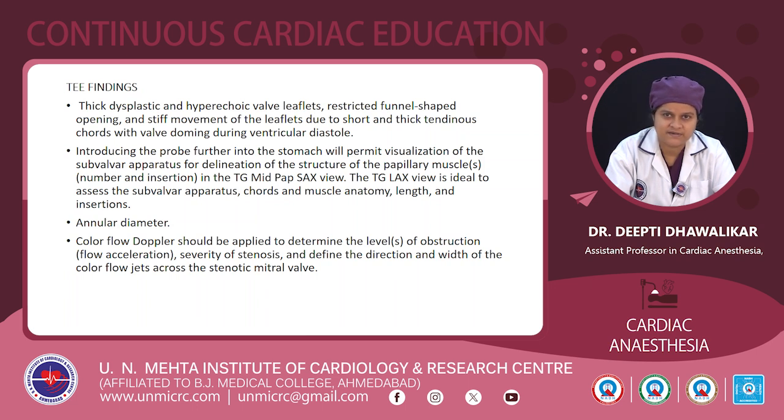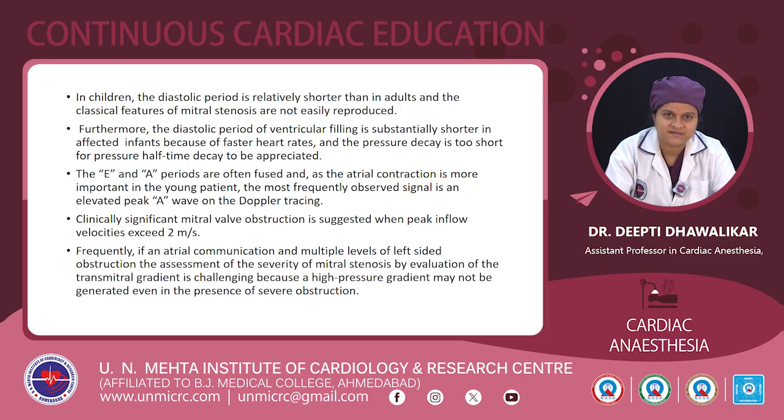The transgastric long axis view is ideal to assess the subvalvular apparatus, cords, and muscle anatomy, length, and insertions. Annular diameter is also assessed, and color flow Doppler should be applied to determine the level of obstruction, severity of stenosis, and define the direction and width of the color flow jets across the stenotic mitral valve.